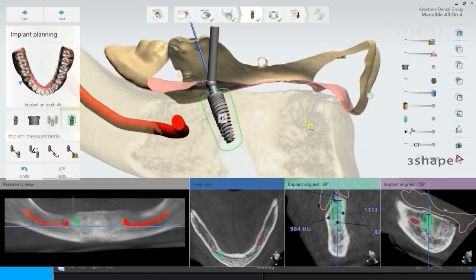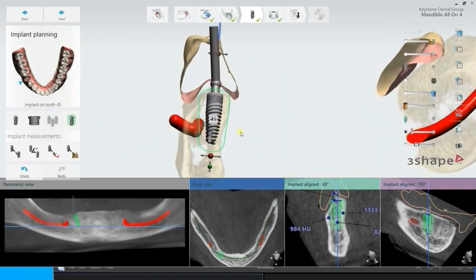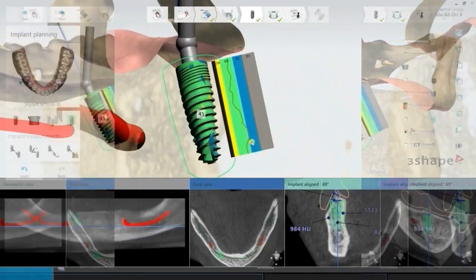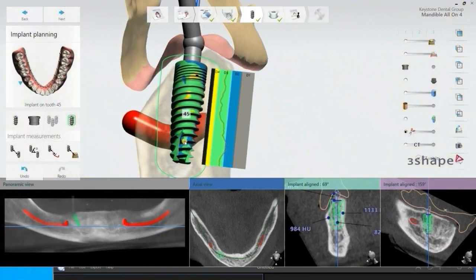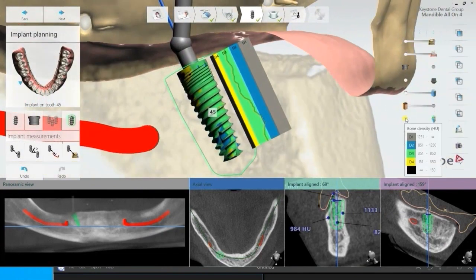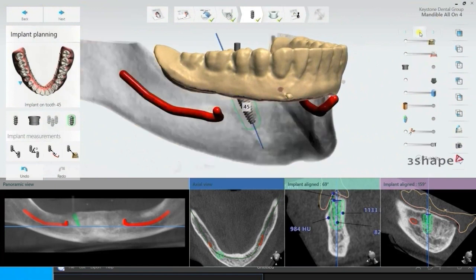Click on the scissor tool to see the cross-sectional view in 3 dimensions. Click on the Implant Hounsfield tool to view the Hounsfield index on the implant surface, ranging from D1 to D4 on the Misch scale. Toggle the view of the DICOM from bone to X-ray view.